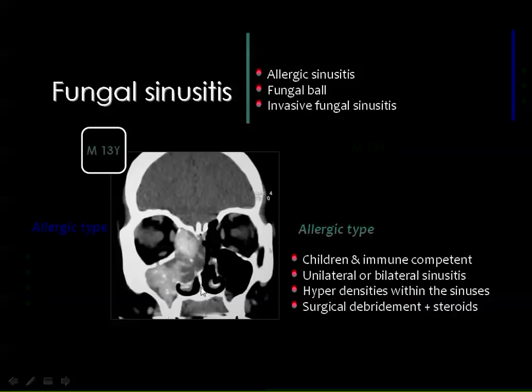If you look carefully, you can see the difference between the secretions due to sinusitis, ordinary sinusitis, and the masses which are dense due to fungus.